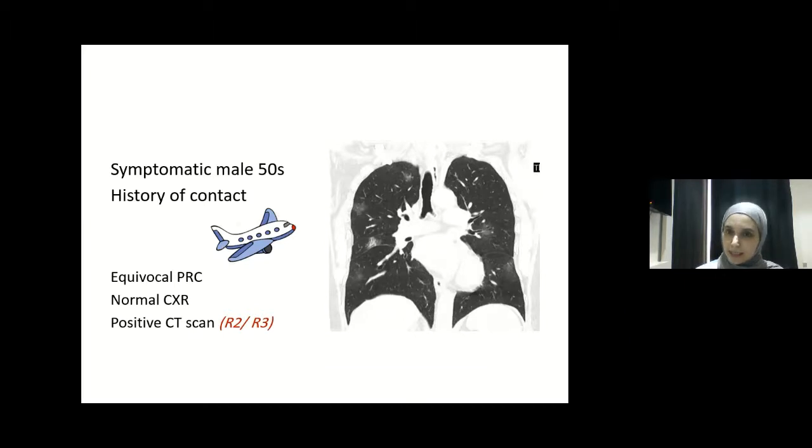Regarding the CT, again, it's an important modality to diagnose and support the diagnosis of COVID-19 pneumonia. This is a 50-year-old male symptomatic patient who has a history of contact. His wife recently came back from the UK and tested positive. His swab was equivocal and his chest X-ray was completely normal. According to WHO recommendation, you need to know whether you send this patient home or you admit him.